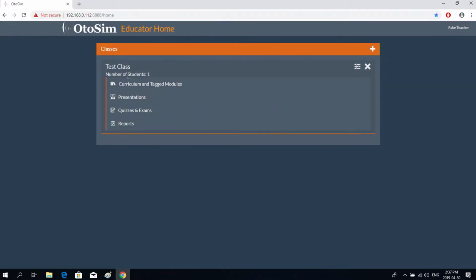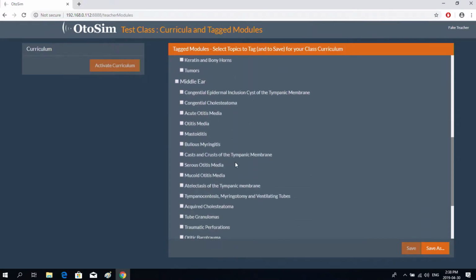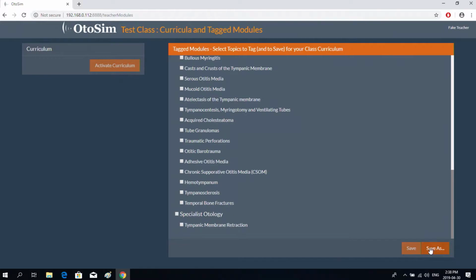Okay, so now I have one student in my class, and that name of that student is fake student. So now I want to create a curriculum for that class. So I click on this. I want to create a curriculum. So let's say the first day of the first week, I want my students to view foreign bodies and cerumen. So I just click off what I want from my content, of all the content in the program itself, and then I save it.